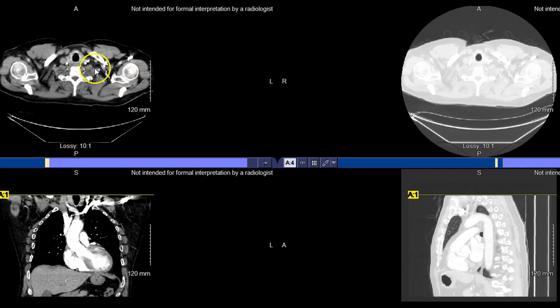To get started with the data set itself, I want to look at some of the bony structures first, and then we'll get into more of the vascular structures going forward. Looking here, you should see some structures that are familiar to you. We've already talked about the spine-based structures, so you can see the spine here. You can see the head of the humerus, and how that's interacting at the glenoid cavity here, articulating with the scapula.